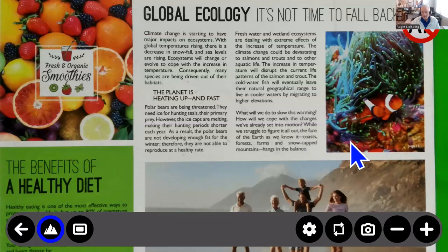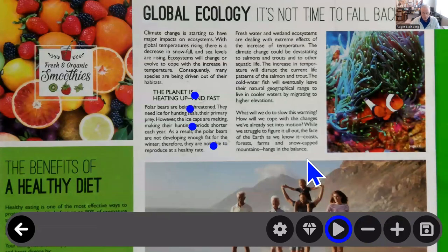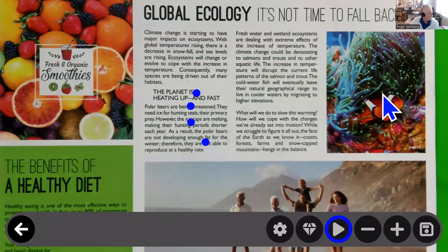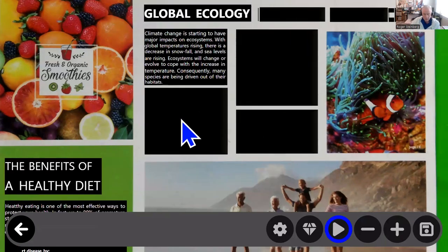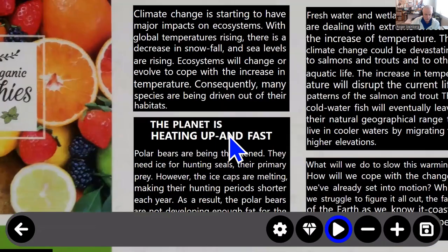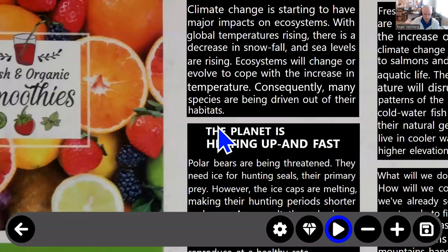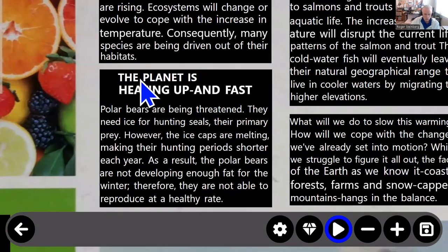Of course, just like I did there, I have the ability to capture a document using my down-facing magnifier camera. It's going to go ahead and capture the field of view of my camera down here. And in this case, we will go ahead and OCR the text. Now you can see that we've captured the text, and I can navigate it live, pan around onto it as I'm doing here.